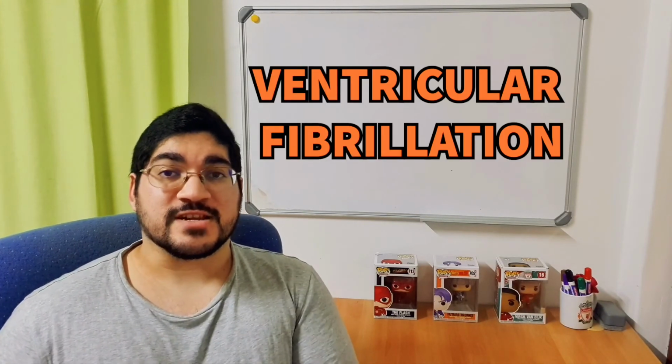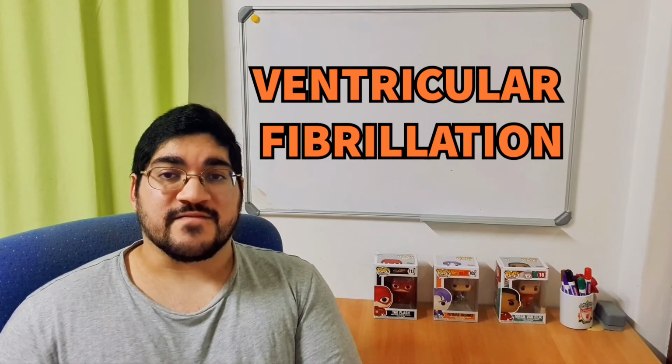And we've come to the last one, the wide complex irregular. So multifocal wide complex, multifocal ventricular tachycardia. And the only one here is VFib, ventricular fibrillation. And VFib, same thing as VTach, medical emergency, you need to defibrillate. VFib is an absolute emergency, you need to take action.